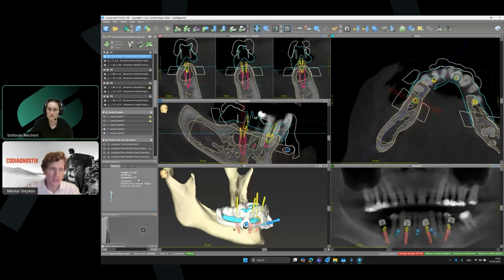It is 17 degrees. And because I can choose the position of the screw of this cylinder, I subtract the following direction, not from the implant. I subtract it from the abutment direction.